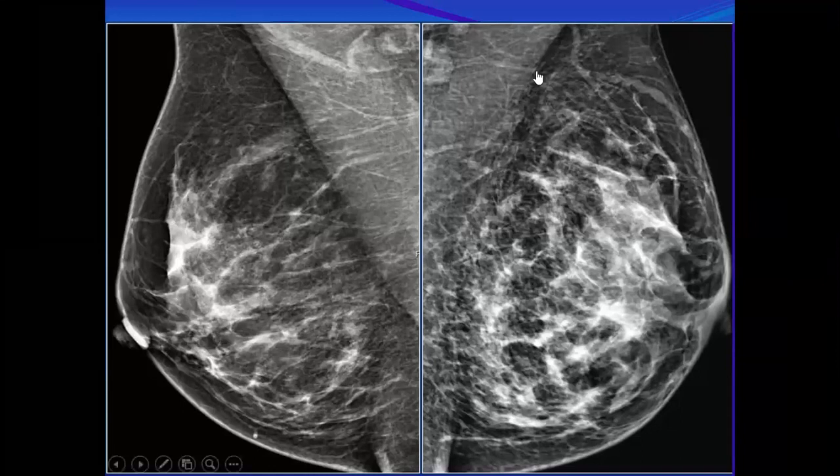The lymph nodes and the prepectoral edema make it a little bit more suspicious. Even here, there are some distortions. The edema and subtle distortion make the pectoralis not very clear. If there is a lot of infection and the whole breast is involved, it might be, but these features are suspicious.